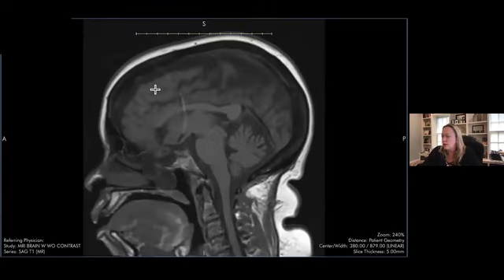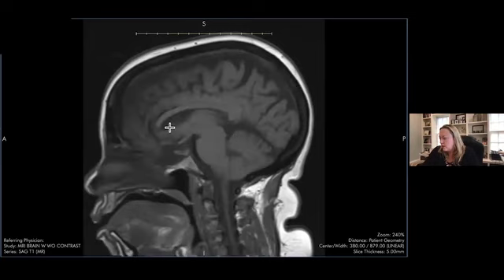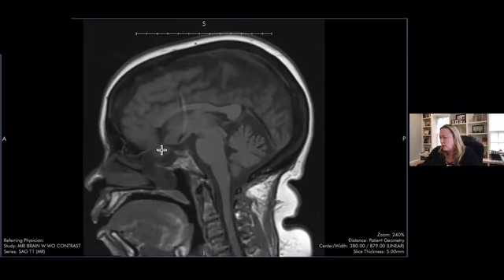And on MRI, you can see there's definite tethering and inferior herniation of brain parenchyma through that bony defect into the sphenoid sinus and extending into the posterior ethmoids as well. So you have both soft tissue and fluid signal extending through those bony defects. And then there's gliosis and encephalomalacia with some volume loss in the left greater than right inferior frontal lobes. And you can see this abnormal soft tissue is isointense to brain parenchyma on all of the sequences. Here's a T2.